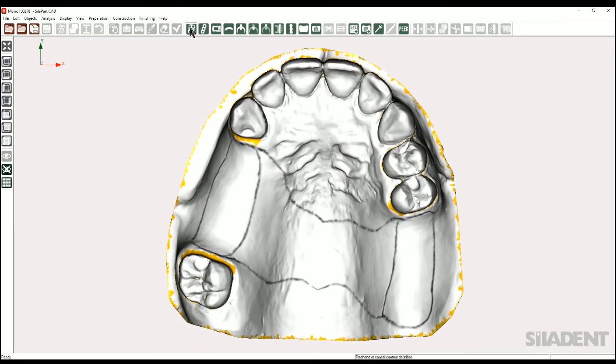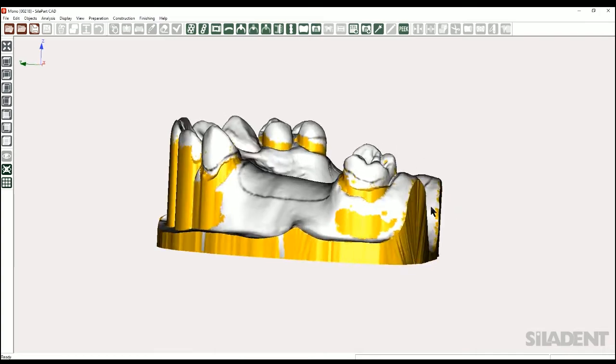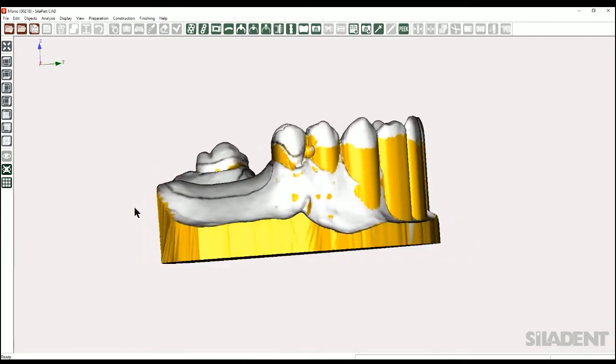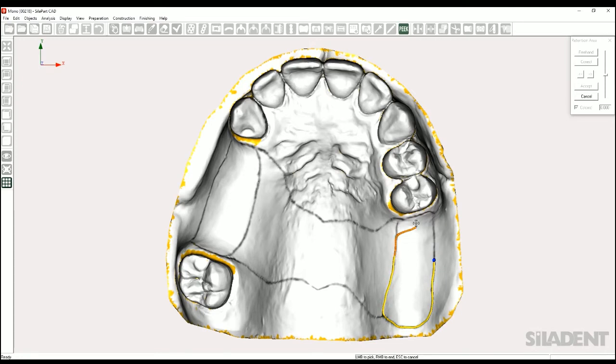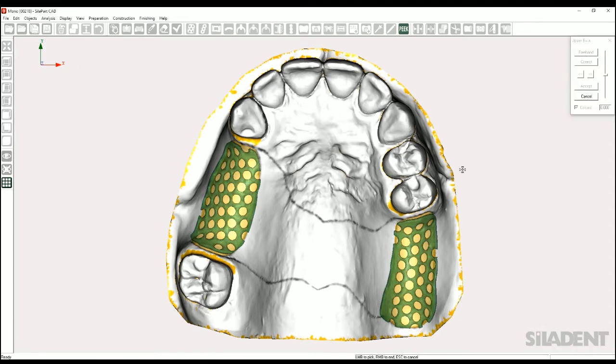The complete construction of the framework is marked on the model with one color. The colors for the undercuts on the teeth can be shown and hidden for a better visualization of the lines. The marked lines on the model can now be used interactively by the SilaPart software. The software makes a color analysis in the middle of the mouse cursor, and the design line attaches automatically to the texture line. With this function, it is enough to activate the corner points of the elements.